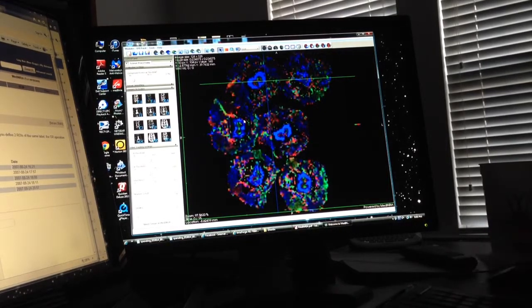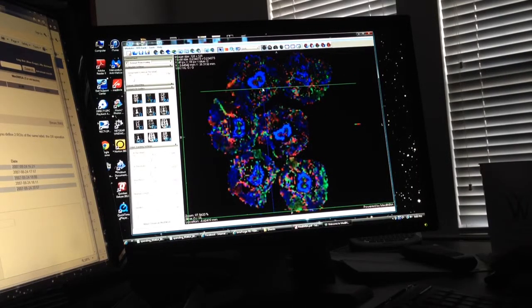So now what I want to do is I'm just on slice 0. Now I can define ROIs across all slices, but I'm just going to define ROIs on slice 0 to show how the ROI will limit the end result. So I hit the J key, which allows me to start drawing. Then V. I don't hit J again, but V.